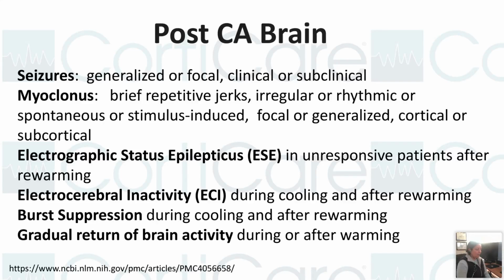And then some patients will come back with EEG background gradually. So that means from some suppression to burst suppression to delta, theta, and even to alpha, to the PDR.